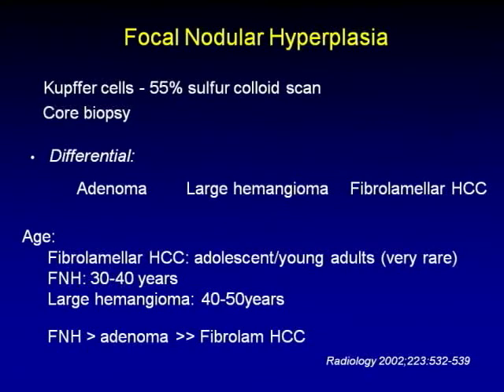If you're using a bimodal gadolinium type agent, as well as giving you the blood pool phase of enhancement that you'd expect with gadolinium, it has a hepatocyte phase of enhancement. So that will be taken up by the hepatocytes in an FNH, and this is starting to be used to differentiate between FNHs and adenoma. But I doubt you'll be asked about that, just a little tip. So there is another potential tool coming down the pipe.